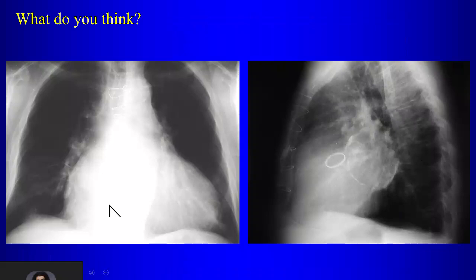I think what we need to do is, we'll finish with this case. So what is calcified here? So that's calcification of the left atrial wall, right? So what's the significance of calcification of the left atrial wall? What is that associated with?